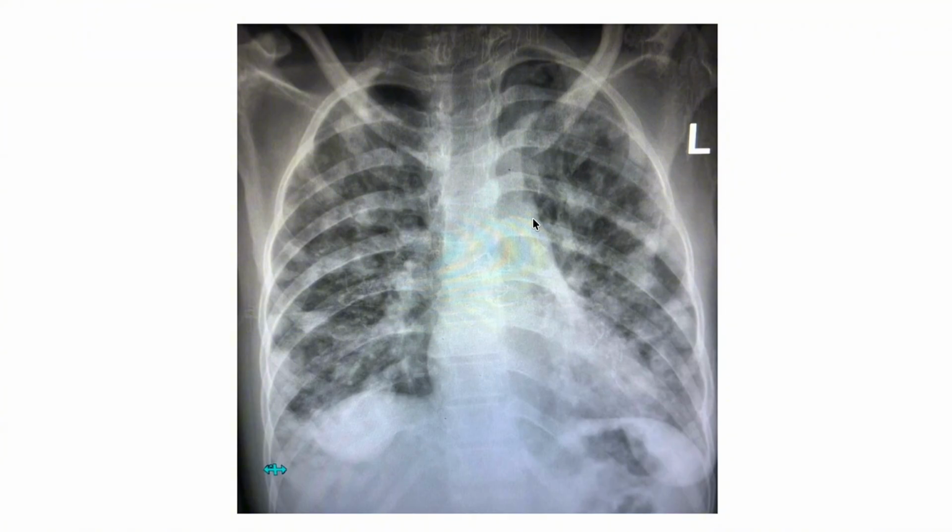Then after I have concluded, I have to go back and look at all aspects of this chest X-ray. Again, I want to start with the wall, the soft tissue. I want to look at the thoracic cage. I want to look at the hemidiaphragms. I want to look at the cardiac shadow, and I settle in with the chest.